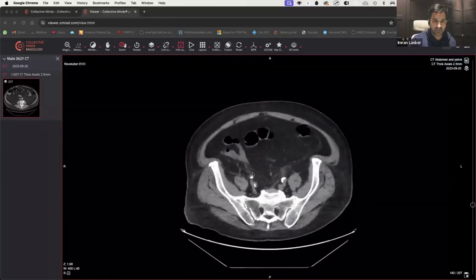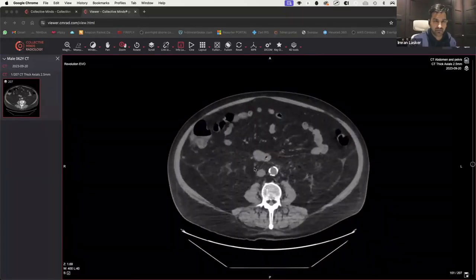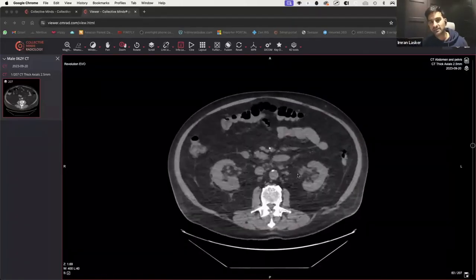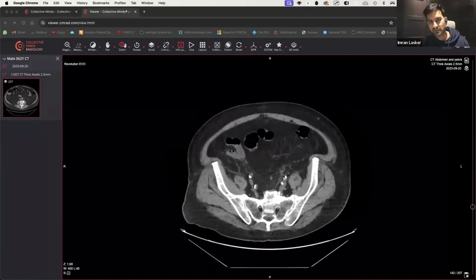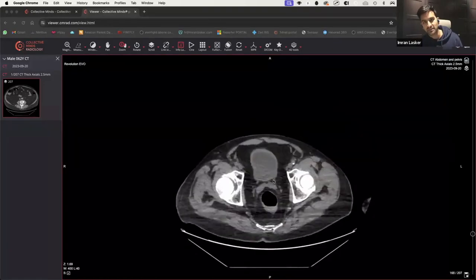You can see that ureter coming around there, coming around there, coming around there, and it all looks very, very thin. I haven't seen any calculi whatsoever. Then we go to this next one and see this ureter go all the way down. Okay, it looks like people know what this is, so I'll go quickly. And you can see the vesicoureteric junction looks okay.